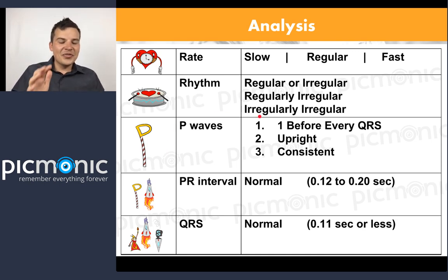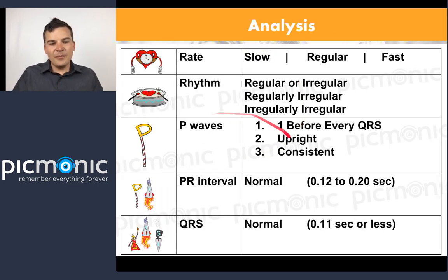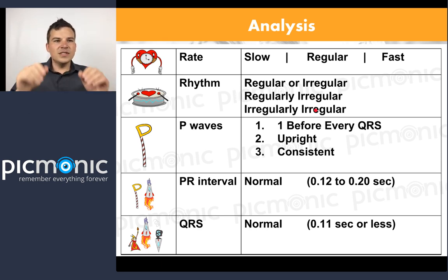Now we're going to run through these examples, and we're actually going to run through this together. So if you didn't catch all this, don't freak out. I didn't intend to harp on this giant list, because we're literally going to run through every single one. As we start with the basics, a basic regular rhythm, we're going to build each one and see how we're building through the process. Because if you can get the easy ones, then you can move to the harder ones, and the harder ones, and the harder ones. Yep, you'll get it.